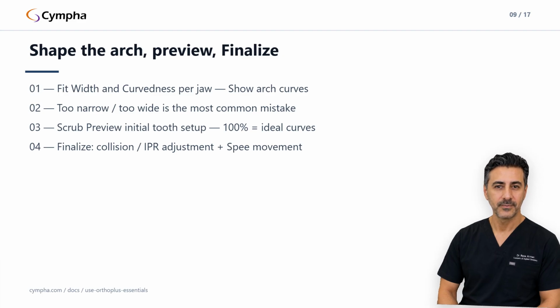In the dental arch setup section, fit the arch with the width and curvedness sliders. Per jaw, show arch curve displays the curves while you work. Spend real attention here. Too narrow or too wide is the most common mistake on this step, and behind most unnatural-looking setups.